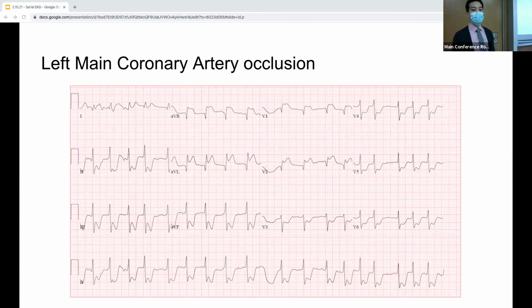Correct, yeah. So the actual definition is just an ST elevation in aVR greater than 1 millimeter, with ST elevation in aVR greater than V1. But yes, this one has a lot more other stuff than just that. Correct. Yeah, and we always talk about a pattern and following 2, 3, and F, or 1 and L and V5, V6. But the two leads that can be very tricky by themselves are aVR, if you see elevation, and aVL, even an inverted T wave or something by itself.